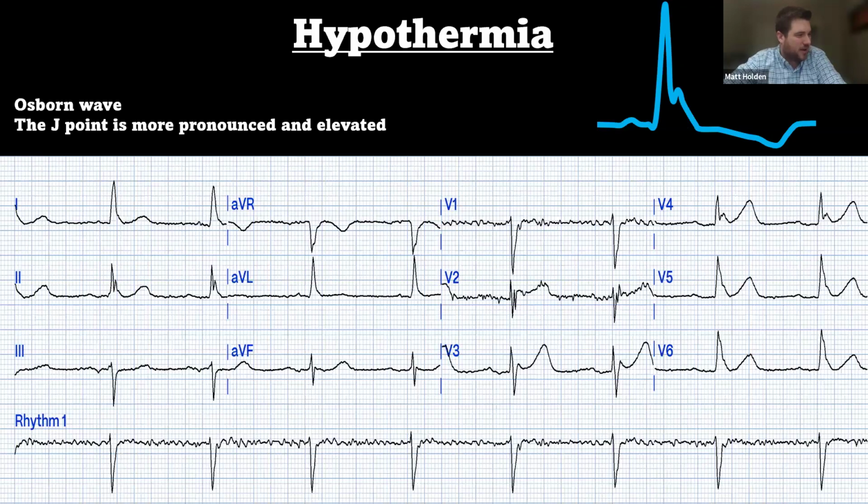Hey, Mustafa, how you doing, man? Allison, yep, V4, V5, and V6. You can see a little bit here in lead 2.